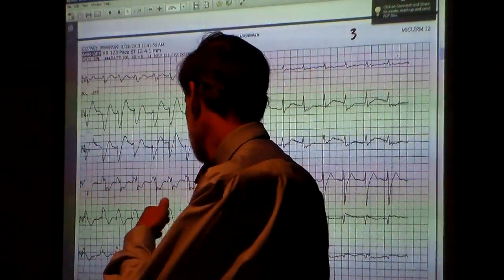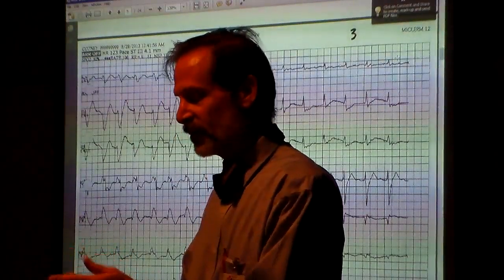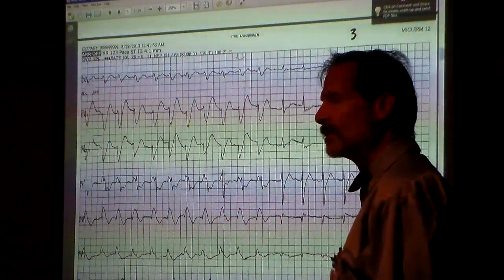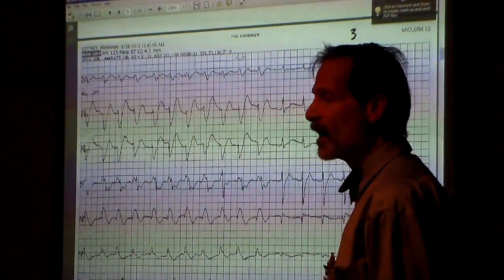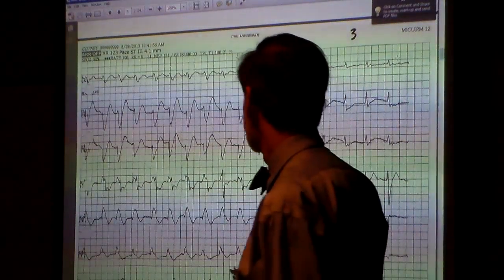I think you get aberrant conduction when you're in AFib with a rapid rate, and when they go back to sinus and slow down, the QRS, they're able to conduct normally in the ventricle, so the QRS narrows, or I should say more normally. This guy had an AICD? Yes. Be lucky you didn't get shocked just from the rate algorithm when he was going that fast.